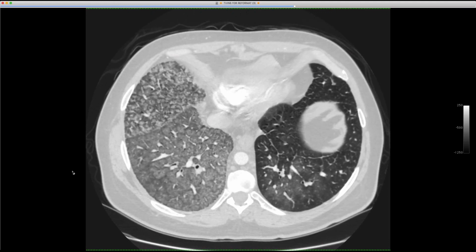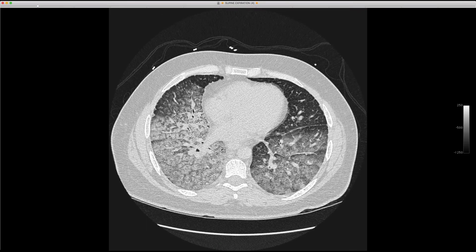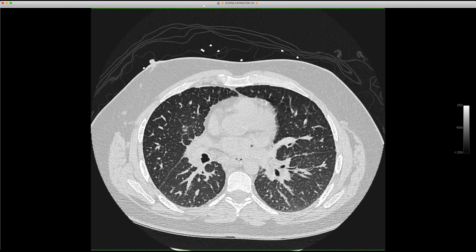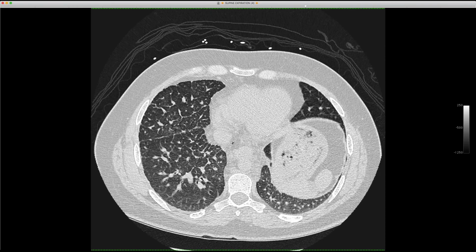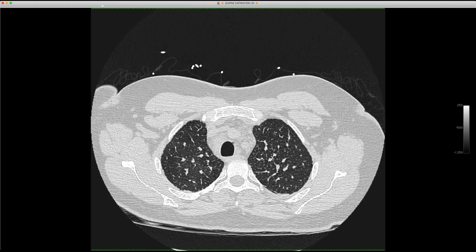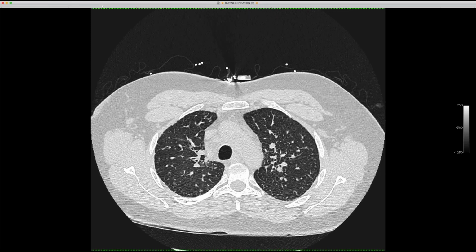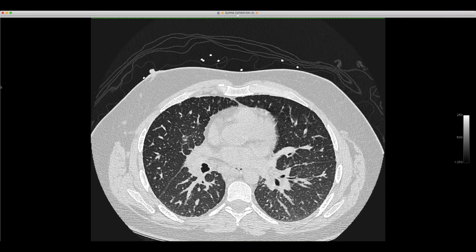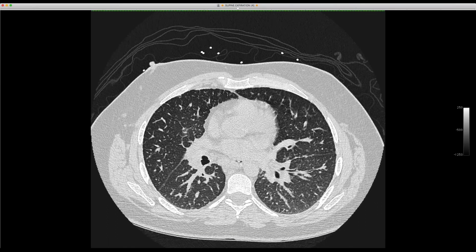So that was February. He was treated with multiple rounds of antibiotics, didn't get better, got a bronchoscopy somewhere else. No one really knew what was going on. So here he was in June, looks pretty much the same. And then 5 days later, he gets another CT, and you can see it got a lot better. And we didn't know at the time what had happened. We looked at IgG replacement therapy. We looked at drugs, hemorrhage, edema. Well, he got a bronchoscopy last week, and he also got some more workup done. And let's see if I can find the bronch images.